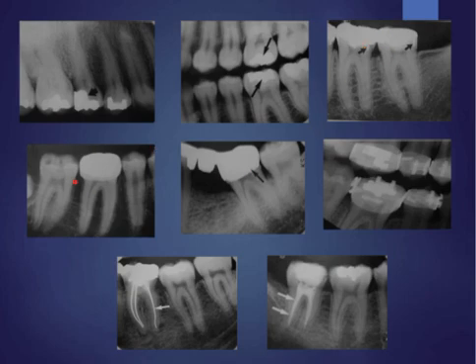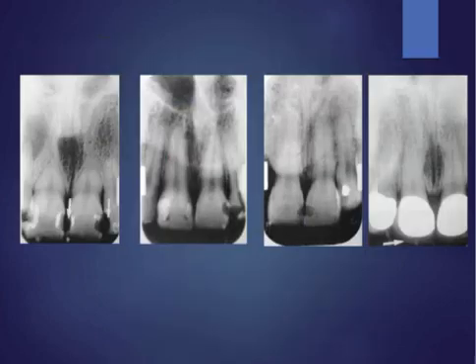This is a crown cap, and what you see here is a bridge. Here, what you see as a circular area is the orthodontic bands. The one with the prominence is called orthodontic brackets. Here, what you see as a thin radiopaque line is called silver points, which is a root canal filling material that was previously used. And what you see here is the gutta percha sticks or the cone.